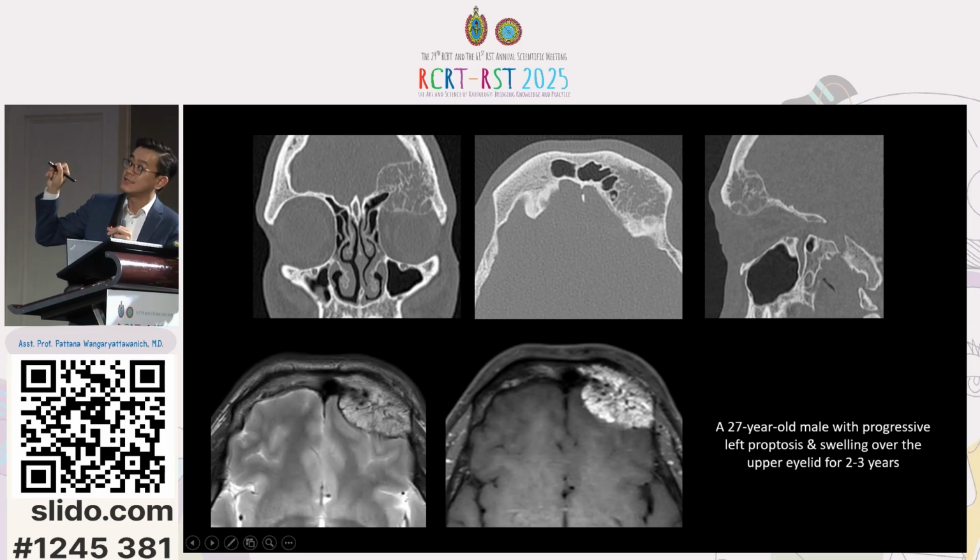Inside the osseous lesion there are pretty nice multiple internal septations, and it kind of looks like a corduroy appearance that we sometimes see inside the spine or vertebral body. On the corresponding MRI on T2, the majority of the lesion is T2 hyperintense and has filling defects from that internal septation.